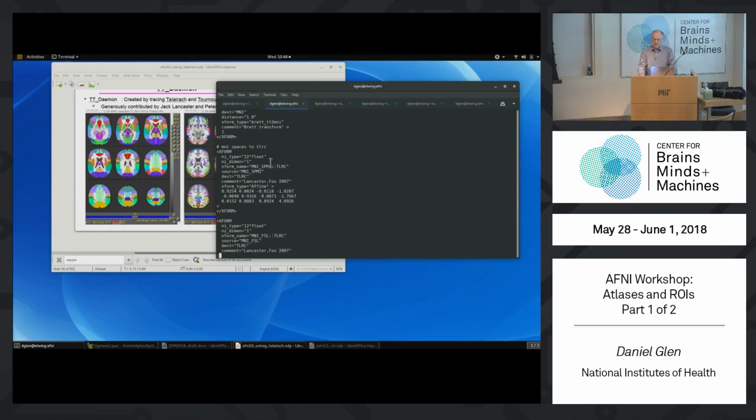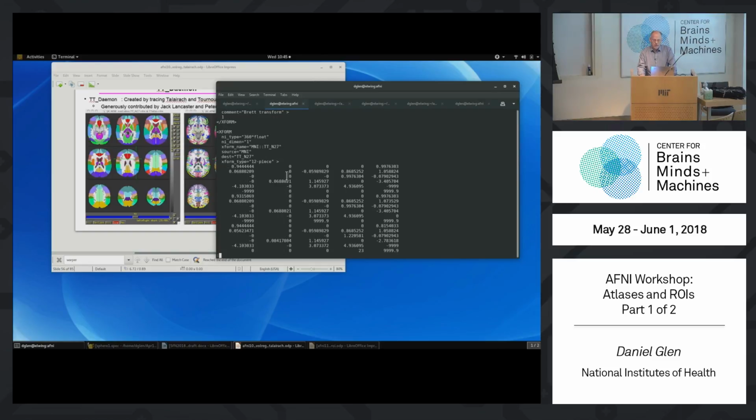And depending on which form, so they defined it for MNI SPM2, MNI FSL, and MNI other. And you'll note that each of these has, well, they can have a distance associated with it. So you can control which one is preferred by the distance. And we calculate how to go from one space to another using the shortest distance. So you can manipulate that a bit. To go from MNI space to TTN27, this is a special case because we transformed the N27 data set ourselves from MNI space to Talairach space, so we know exactly how that happened. We used a 12-piece manual transformation, so to go back, we just have to apply the inverse of that transformation. So here's one way, and then we can just calculate the inverse.